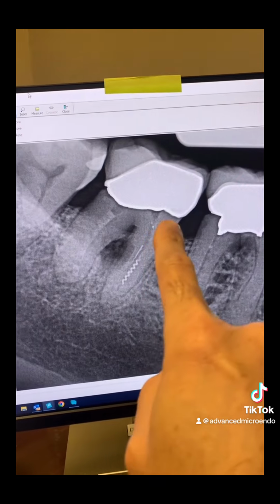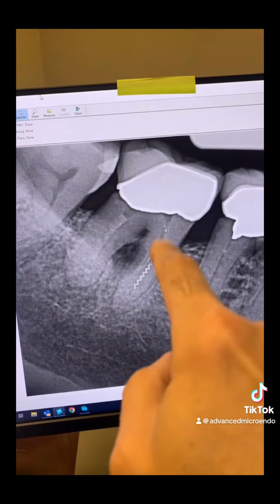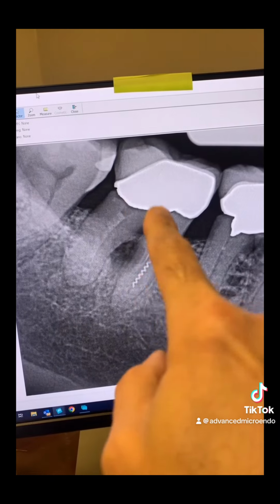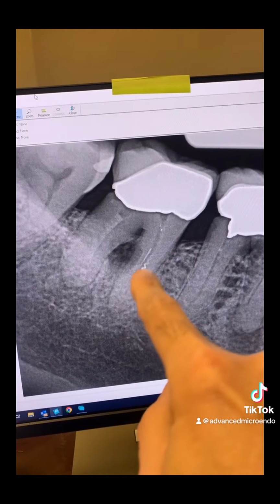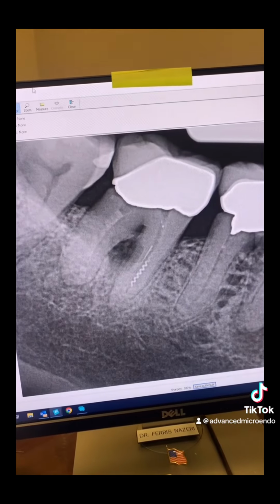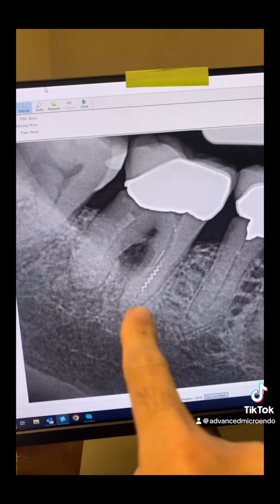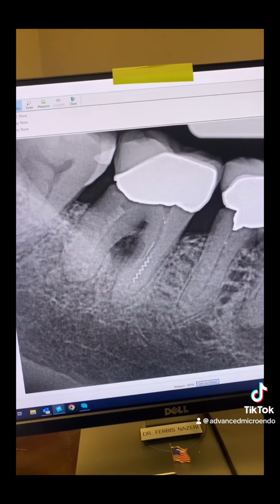But let's look at tooth number 31 now. Again, crown, open margin here, Russian style root canal, furcation involvement, lentula broken here, and another file broken there. But as you can see, there is no periapical lucency on this tooth. Definitely furcation though. All right.